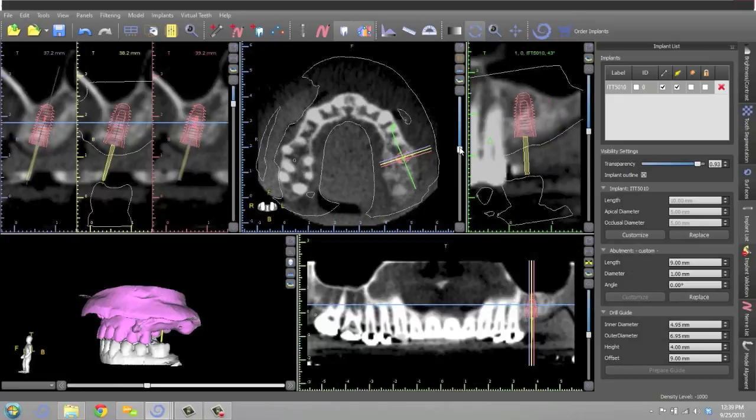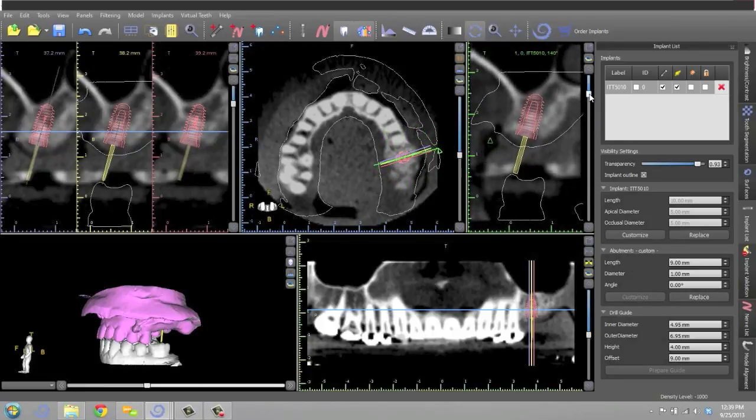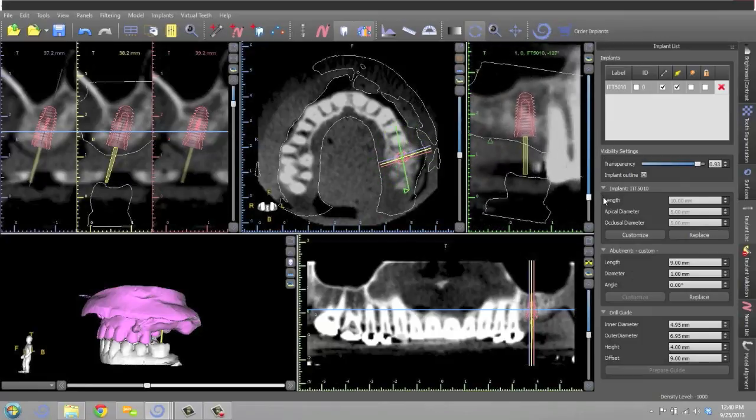And then when you swing it around, you take the slider, swing that arm around. Now the triangle's going buccal. So now you have a perfect cross-sectional view. And you can see again, obviously, the buccal cusp of the lower tooth. You can see the gingiva above the surgical site. And you can move things around. So this is a really powerful tool because you get to see everything 360 degrees around the implant. And that's called the tangential view.